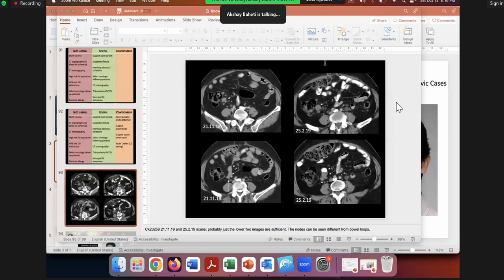Rajat is asking, besides the reniform shape, anything else to differentiate node from mesenteric deposits? The reniform shape, presence of fatty hilum, ovoid shape, I think is enough for me. Ovoid, oval, generally I will ignore them if it's mesenteric. Okay, they're generally not deposits, they're nodes. Okay, anyway, with a lot of peritoneal disease, you expect reactive adenopathy, right? Also, so that's what it generally is. Gastrohepatic ligament I showed you, right? That's part of the lesser omentum.